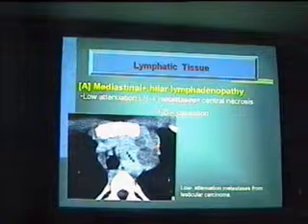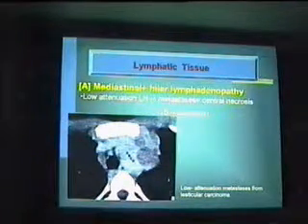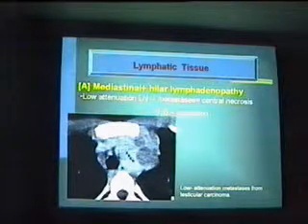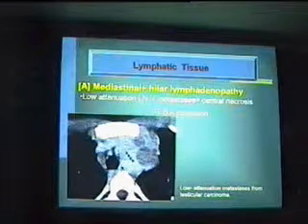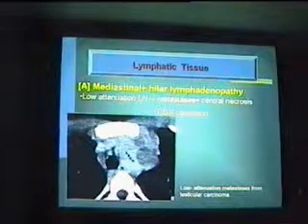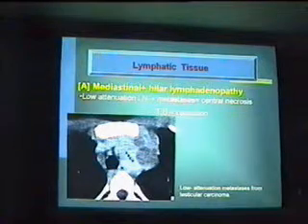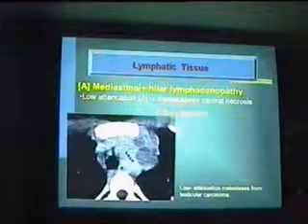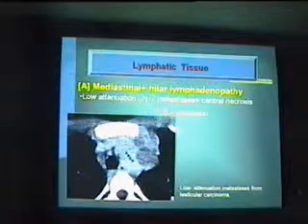The presence of low attenuation within the lymph nodes suggests ان انا عندي breaking down. والبريكنج داون ده ممكن يبقى في حاجتين. ممكن بريكنج داون due to necrosis لو عندي نيوبلازم او كاسيشن لو عندي تي بي. فبرضه هشوف معايا التشينجز في اللنج. هل عندي tuberculous changes of the lung؟ هل العيان صغير unknown to be tuberculous؟ كل ده هيعضد لي ان انا اقول ان ده caseation and not necrosis in metastatic lymph node مثلا.